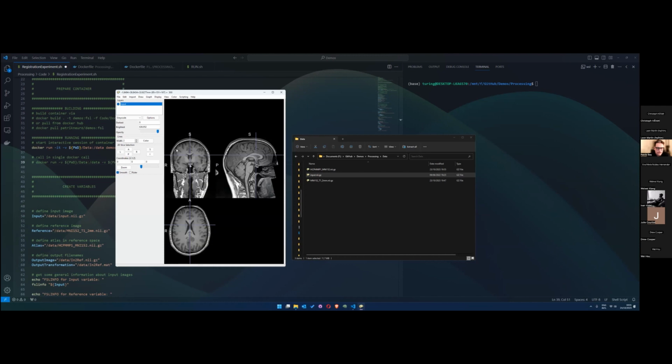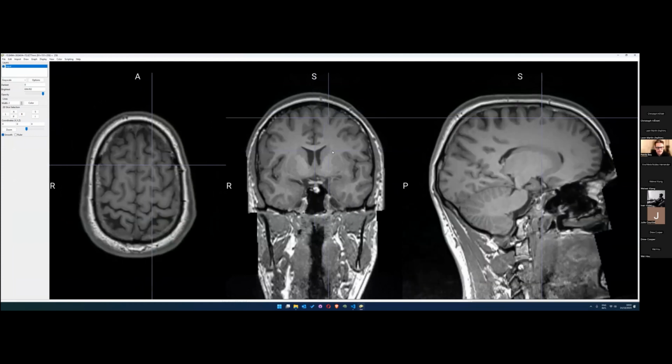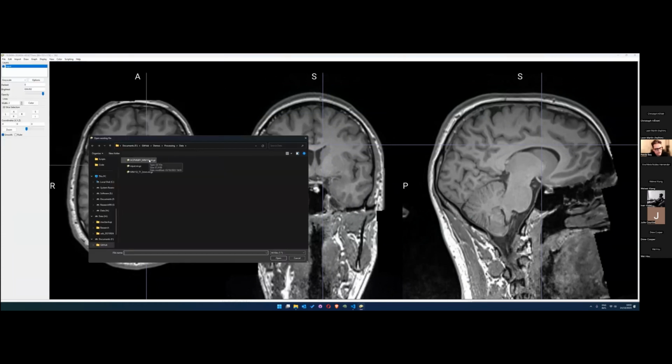And we want to use this brain data and then use an atlas that we have to get my brain regions of interest. Actually, let me make this a bit larger so you can see better. We want to use the HCP MMP1 atlas, the multimodal parcellation based on Glasser.